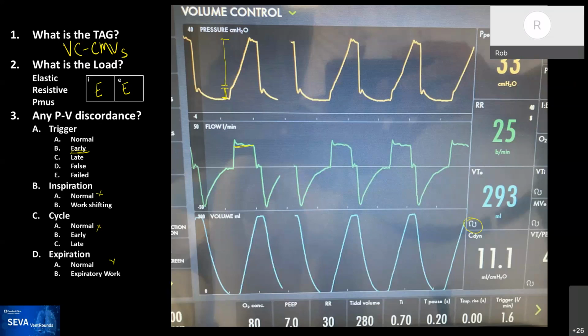And that's a common thing because there is no marker. It would be nice if it said volume control with a little icon to tell you that the flow adaptation has been activated, so that you would know, one, that it's active, and two, what the tag is. But just by looking at the waveform here, it's impossible to see.